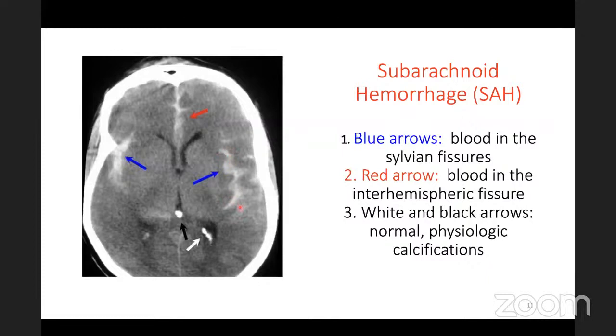These are called the Sylvian fissures. And again, the interhemispheric fissure also, it goes in between. So you can see this line perpendicular to the falx. So you can see that these are all the small fissures which go into the gyri, that is, which form the sulci. So blood extends into this. Hence, these are subarachnoid hemorrhages. That is how you make a diagnosis of these hemorrhages.